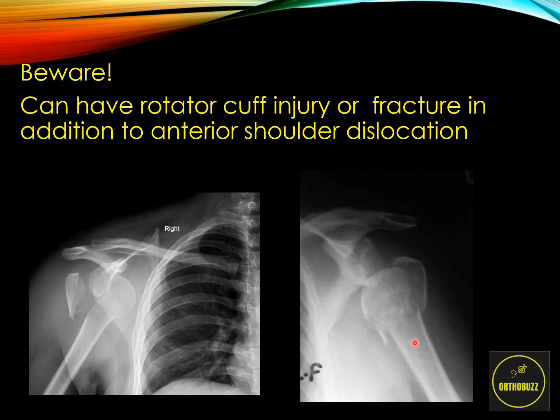This on the left-hand side shows two or three fractures of the proximal humerus, and as you can imagine, attempting to reduce this in the emergency department would just cause you to pull on the humeral shaft, which is not attached to the proximal humerus, and therefore will not be able to control the proximal humerus and reduce it. Therefore, this should not be attempted in the emergency department.